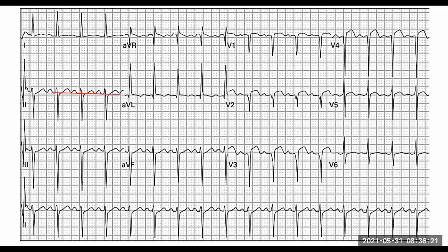Right. Now look at your ST segments. Do they deviate from the ST line? Not really. It's kind of there, isn't it? It just sits over there. Let's look at the next one. All right, so there's our baseline. In other words, that's when the heart is at rest. And what do we notice there? Kind of sits there, isn't it? It's not really going anywhere.